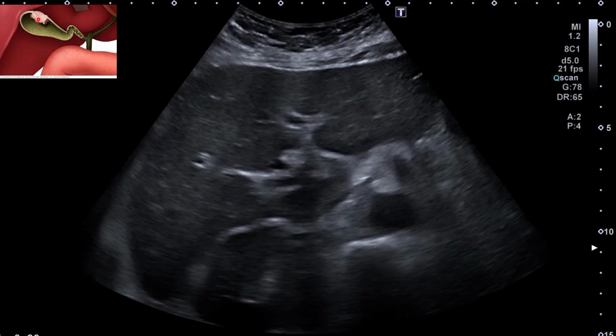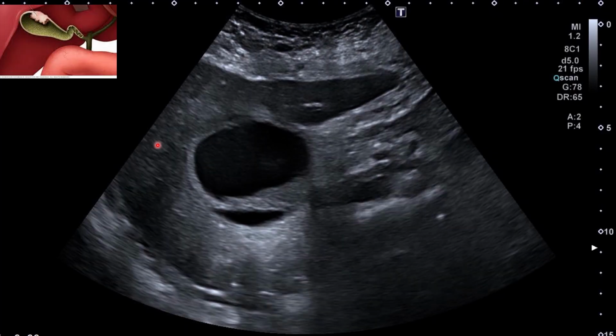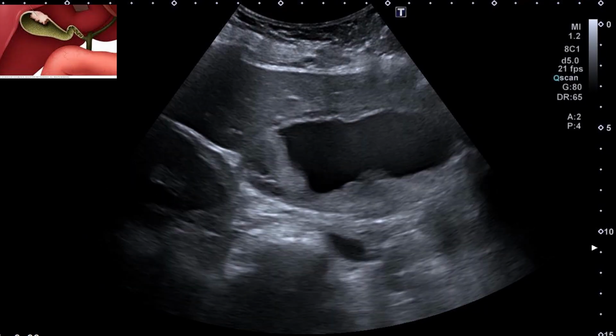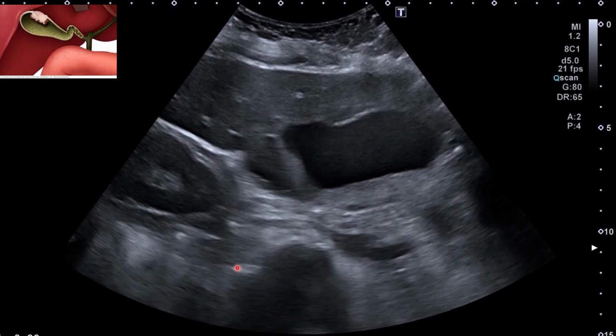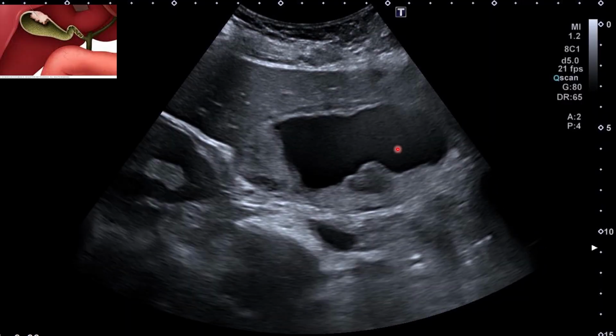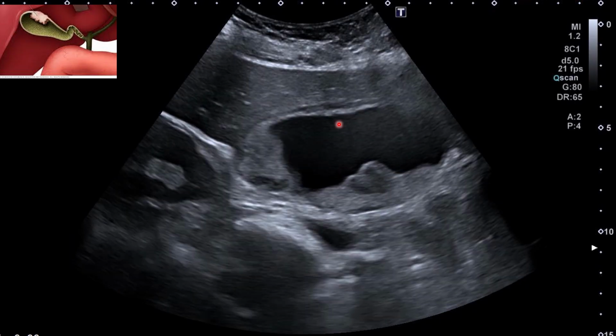So you see, if you've got a mass on the gallbladder that develops in the walls, that mass will always be suspicious. But you can see in my case that this mass has no color flow on Doppler, though the walls are very thickened, as you can see here.